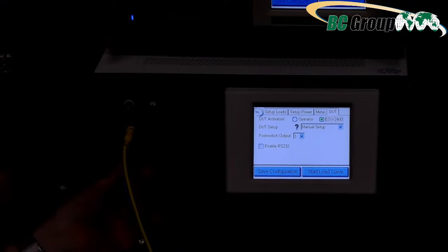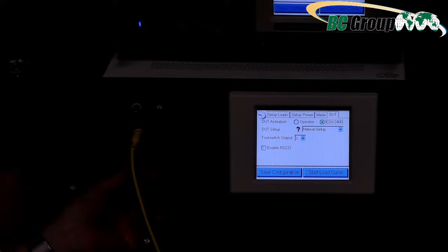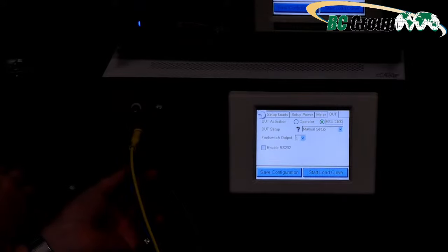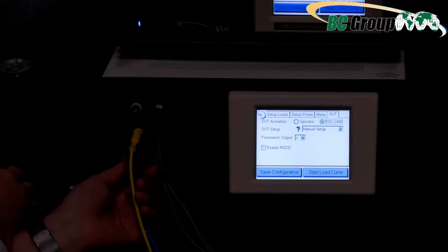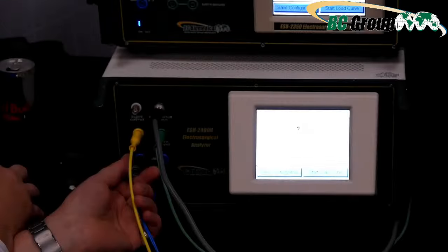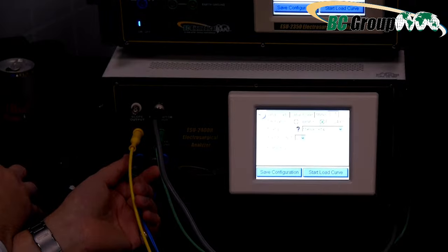It got darker. Okay. Well, I can tell I'm going to fight this the whole entire way, guys. Okay, let me make it a little bit lighter for you guys, all right? There we go. Okay. Well, you see how finicky it is.